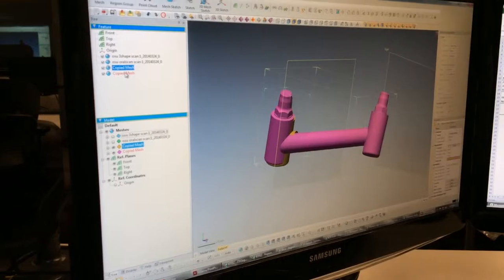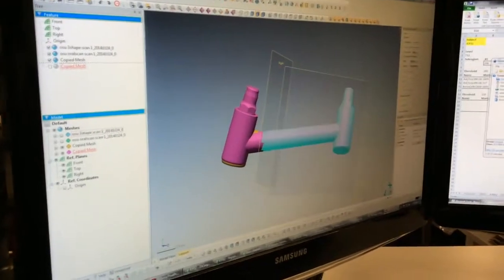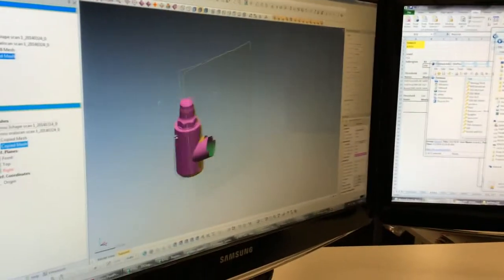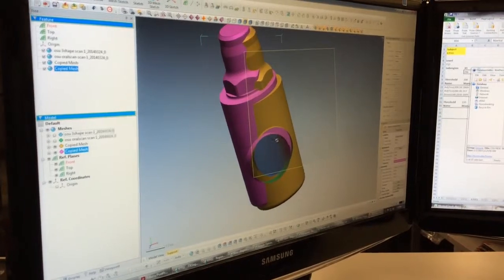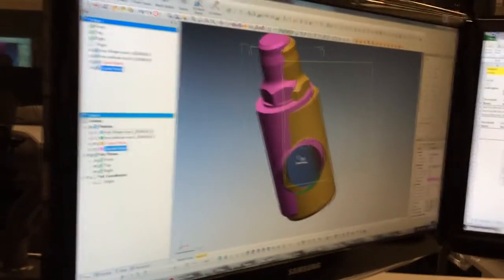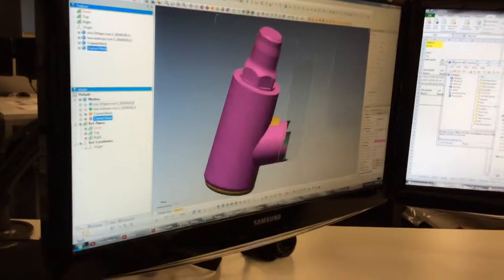And then if I want, I could go into this one and do the exact same thing, delete. And ideally that can give me good data too. So now you could get deviation. The one thing that's a little bit funky, depending on how far apart these are, you might get some weird data. And again, the bar is not CAD designed. It's CAD designed, but it's hand CAD designed, so it's not the same connection.